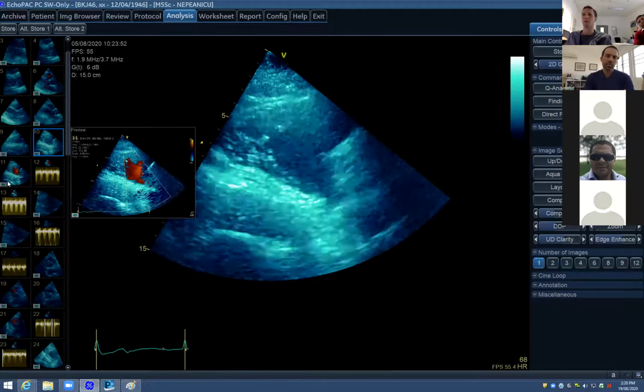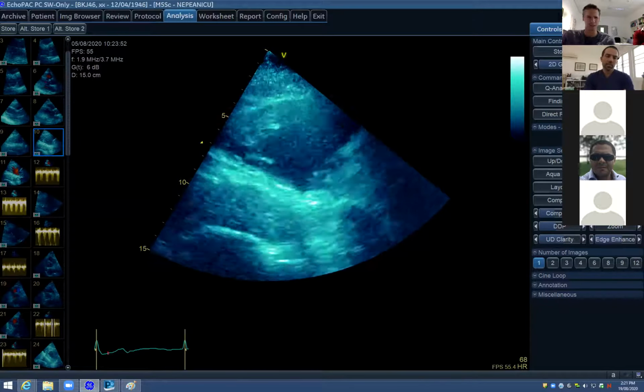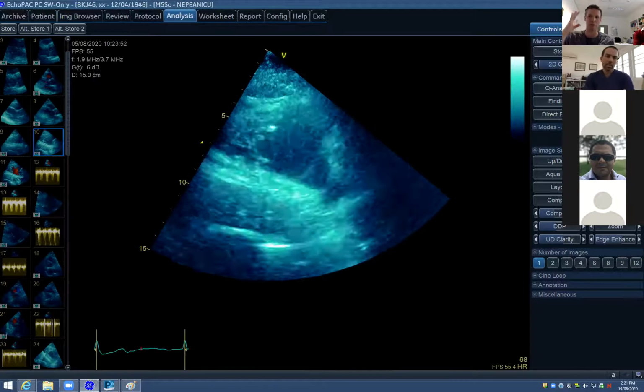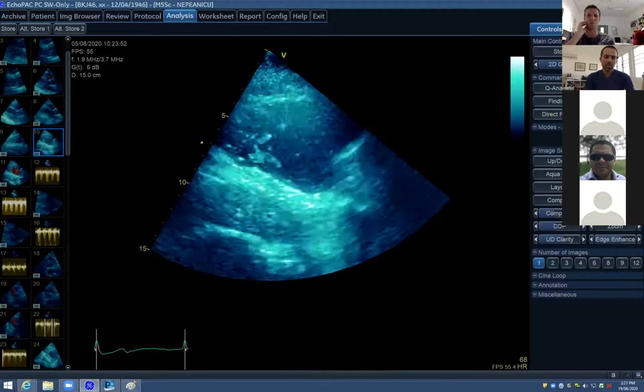Emma, I'm going to keep on hammering you for a little bit. These are just little signs of features, rather than taking us through the whole image. But there are a few things that I'd like to jump out at you when you're starting to report these things, and I'll show you what jumped out at me when I was going through these. So what's jumping out at me on this one?